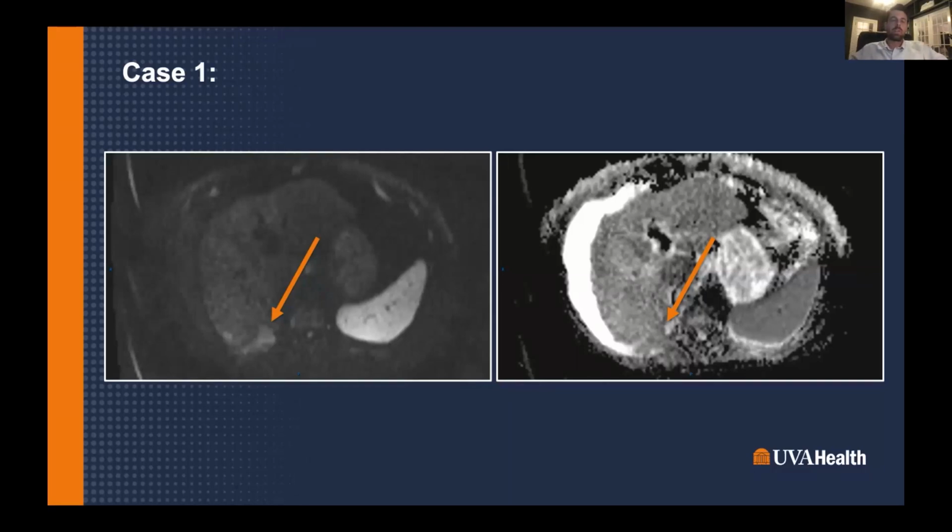I think so. But you can clearly see that it's at the margin of the tumor, and the other part clearly responded. So my thinking, at least, I may be wrong obviously, is that the majority of the tumor clearly responded. And this one may have a different blood supply, and you can go back in and treat it, but don't say that radioembolization was a failure. You can go back and treat, or you can wait.